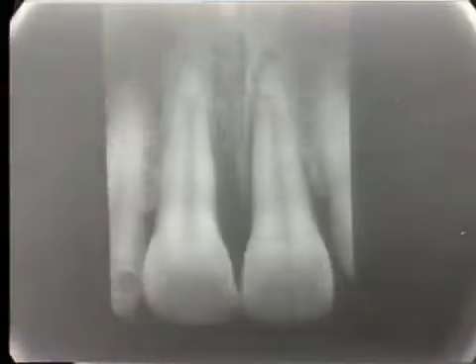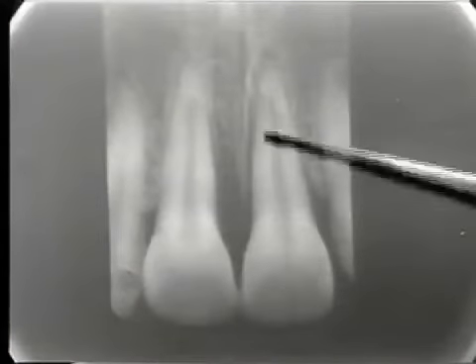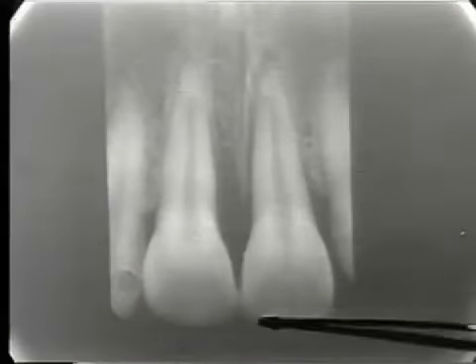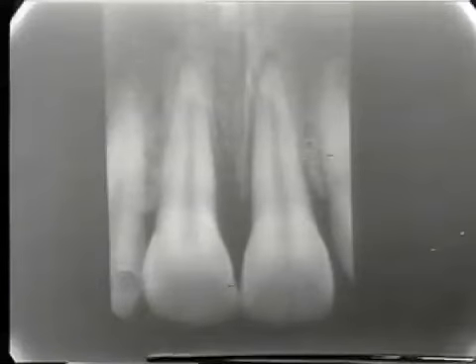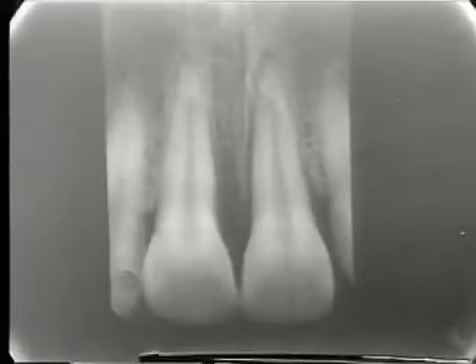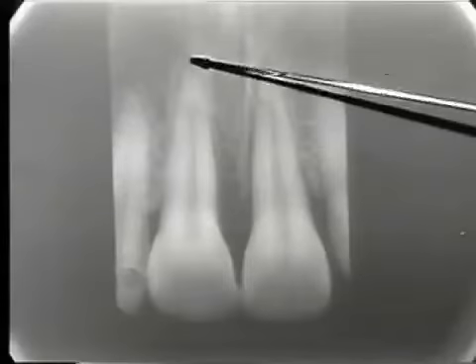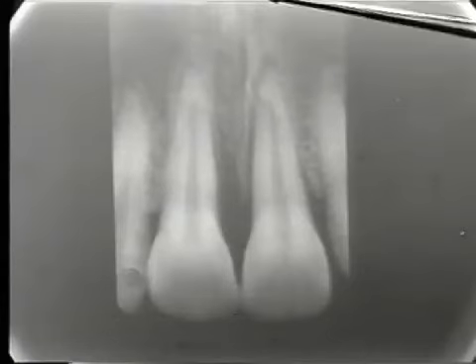The type of radiograph that is produced then is pictured here. We have the tooth recorded in proper length. There is a small amount of black border reproduced under the incisal edge. That's the amount of film that was in the slot in the bite block, and we also have regions superior to the apices of the teeth in register.